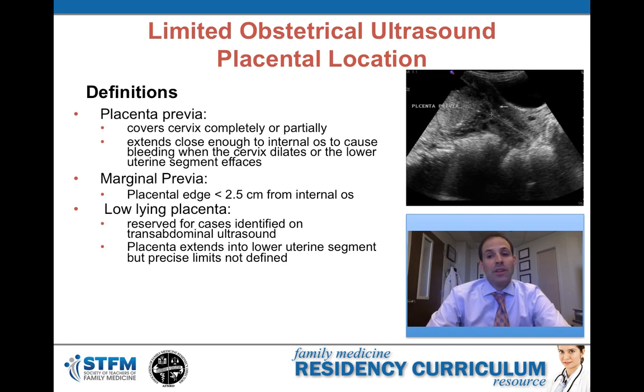This here is an example of a complete placenta previa, and what is outlined with the calipers is the cervical canal, and the placenta here extends completely over the internal os of the cervix, representing a complete placenta previa.